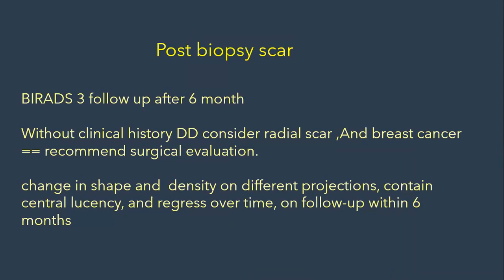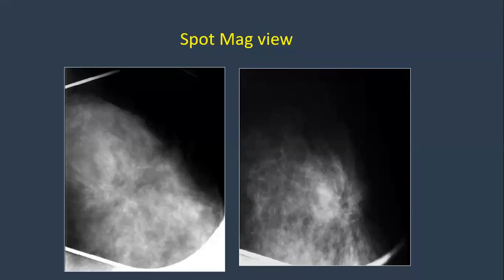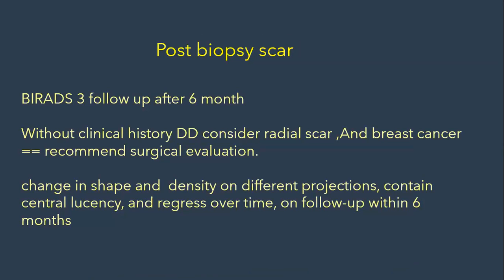Okay. Can you look for anything here? Is this a biopsy scar, or an interventional scar? Look for the scar. Sometimes it gives a different shape in different views. Look here and there. You see the shape a little bit different in different projections.